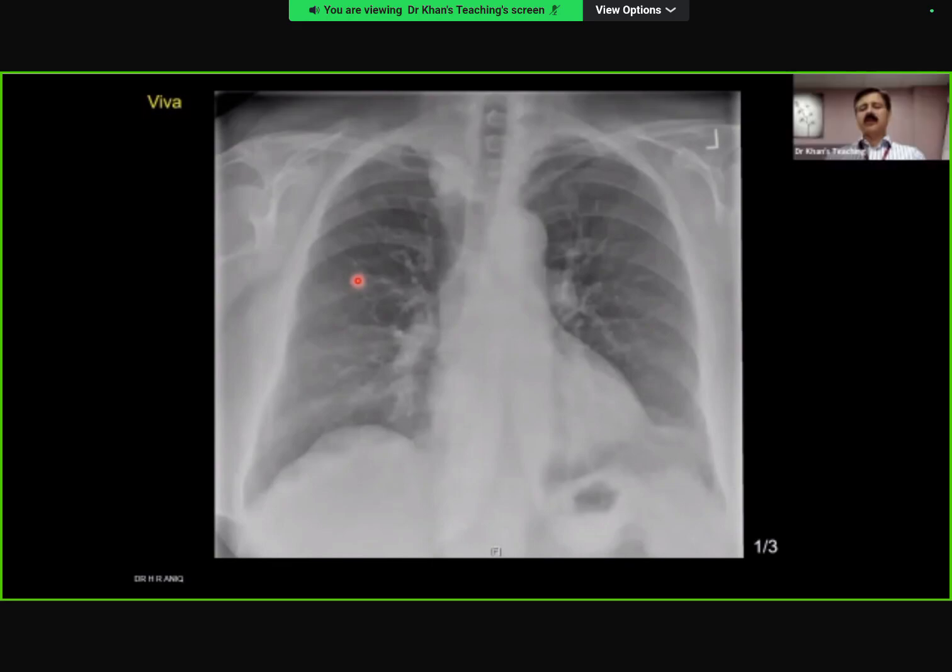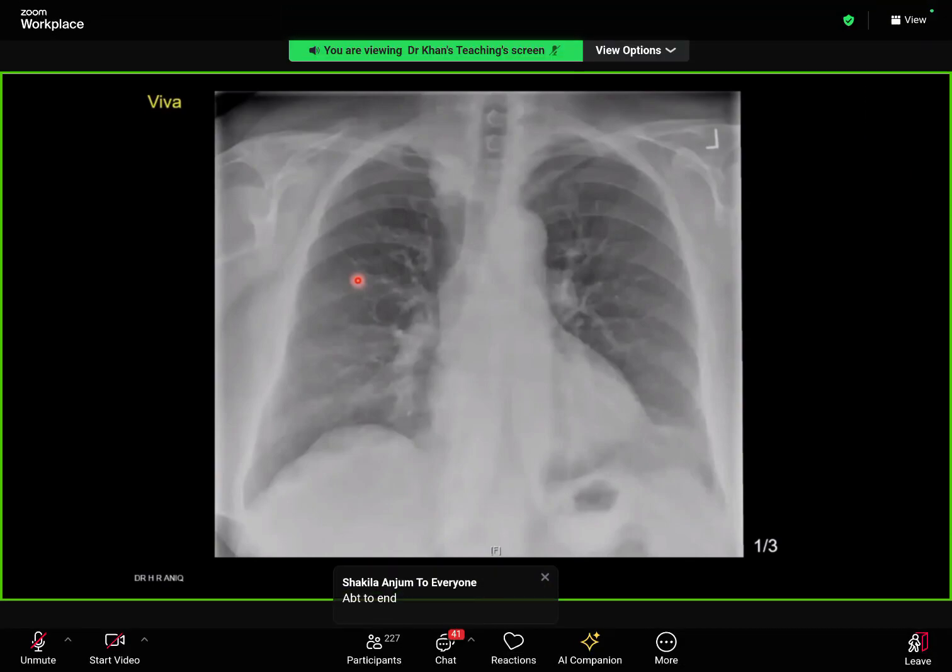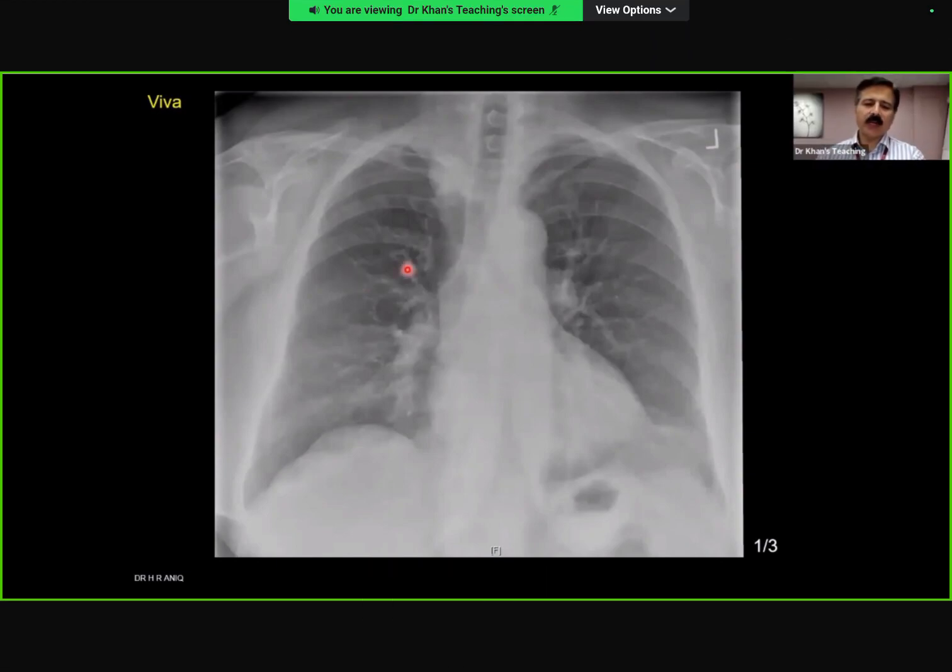Is it in the anterior mediastinum? Is it in the posterior mediastinum? Where is it? So I think the cervicothoracic sign is positive. And what does that mean? Well, I can't remember. Okay, well done. Okay, classical exam case where what happens is if you pick up a mass here.